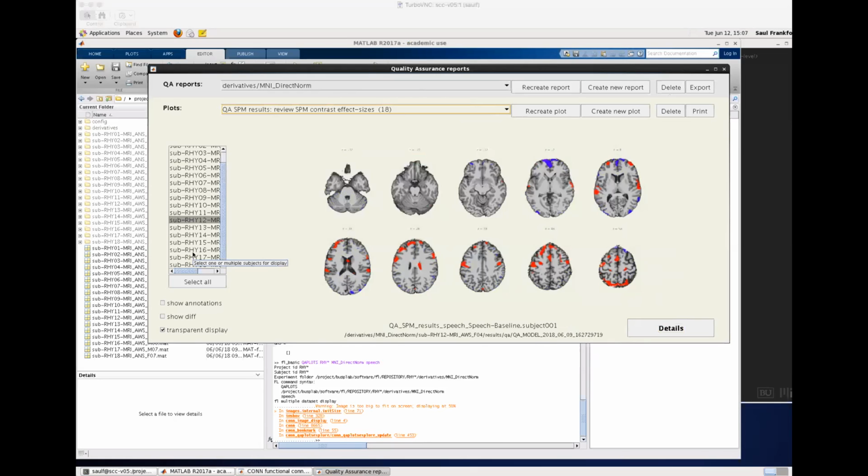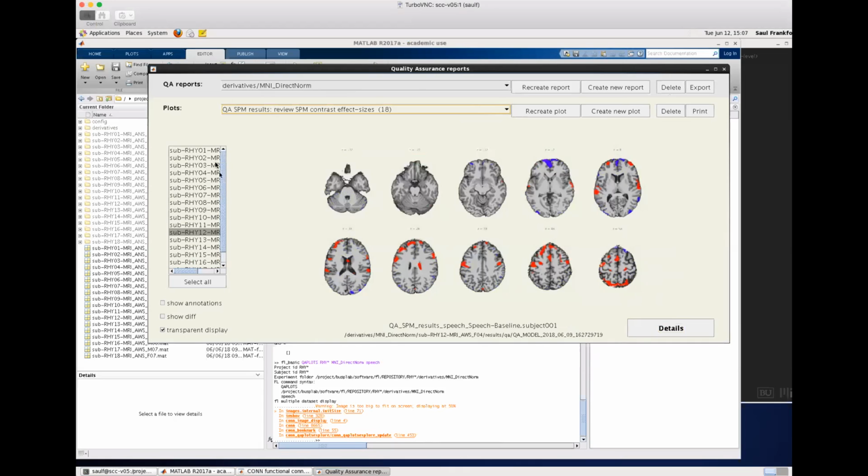Okay, that sounds good. And then maybe if I can quickly click through here just to see if all these, I mean, most of these are right, you want to look at these plots for every subject just to make sure that you don't see anything unexpected, because if something hasn't been flagged by the histogram displays, it still might be something wrong that might be worth looking at. So you want to look at the non-variability across the rest of the subjects and whether there is some particular subject that looks particularly strange.